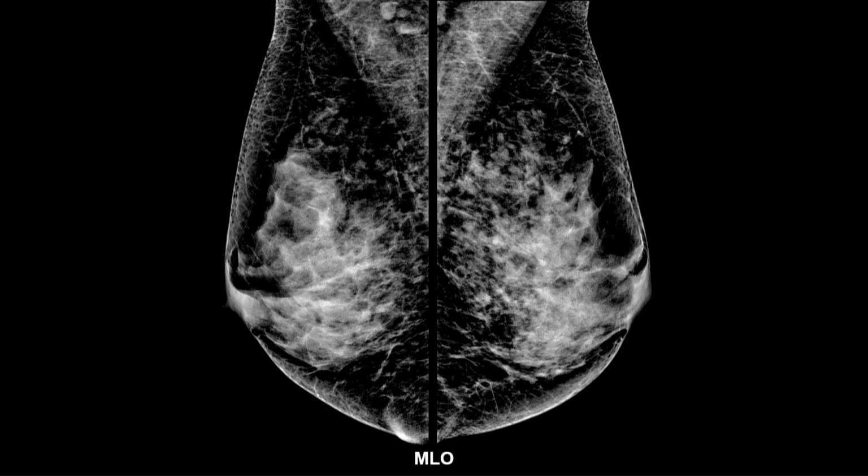The workstations are quite capable of adjusting for these differences in image quality so that you have a perfectly interpretable image at the workstation. But slides are more difficult. So when you see slides like this, it just means it was a high contrast image, and the slides aren't good enough to be able to show it to you with the correct grayscale. At any rate, you can still see the findings.